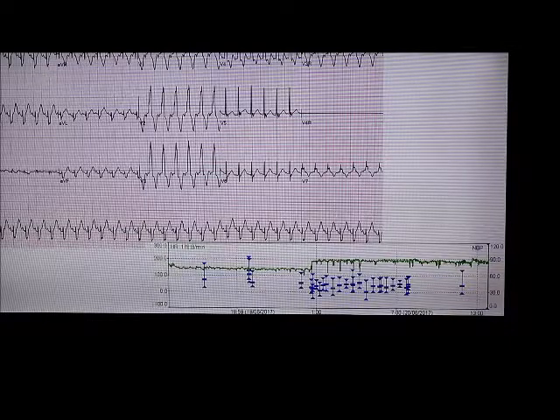And sometimes if you have a focus just near the sinus node, it can give you a P wave morphology similar to the sinus node. But if you just look at the ECG, you'll say it's normal. But looking at the heart rate trend tells you that it's not actually normal. So if I didn't bring you this, then I would accept if you would say sinus. Then maybe I would say sinus as well. But the trend is the one that points you that there's something wrong.